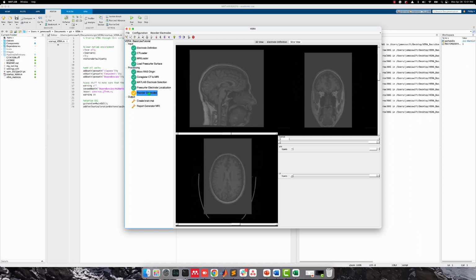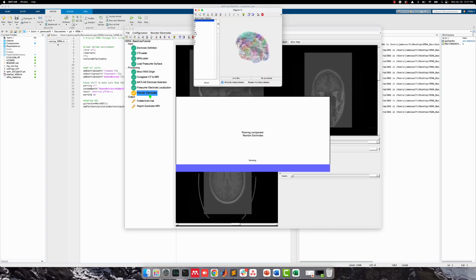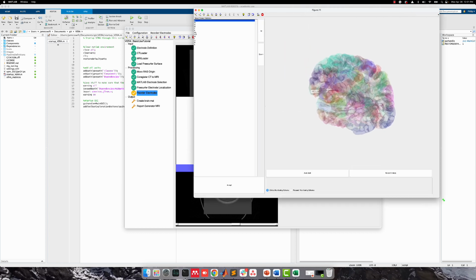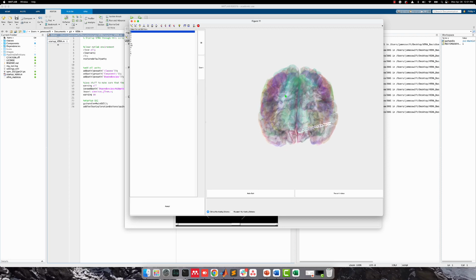The last step of this simple tutorial pipeline is to fix the electrode numbering. Implanted electrodes are typically numbered from distal to proximal. Again, you can rotate the brain model using the orbit camera tool to see if the electrodes are numbered properly. If they are not, use the Resort Indices button to manually set the electrode numbering.